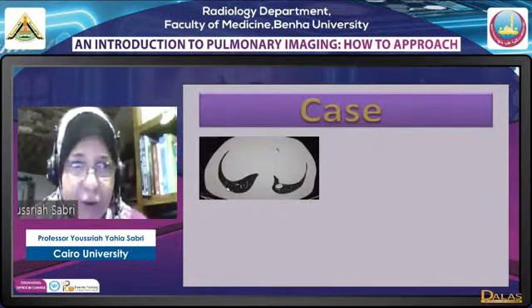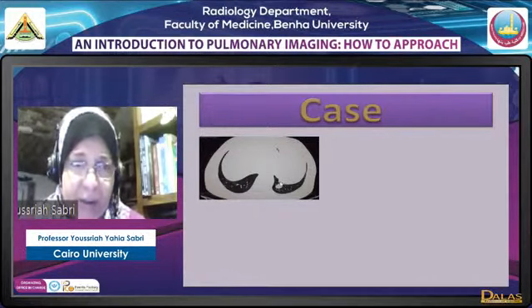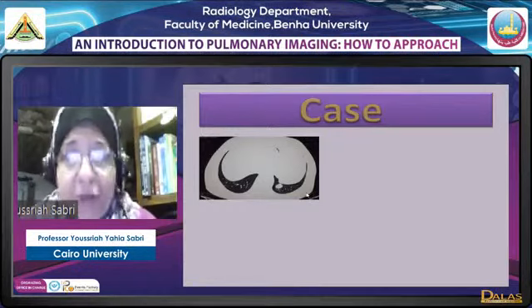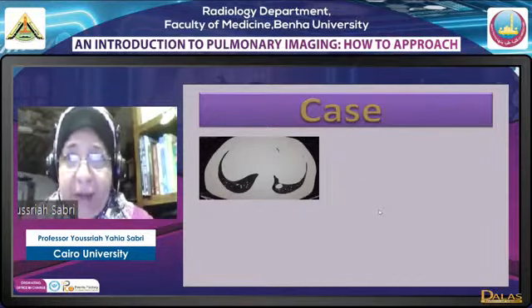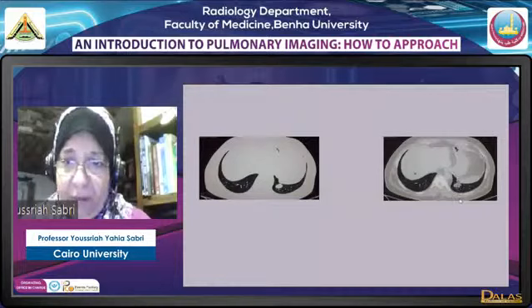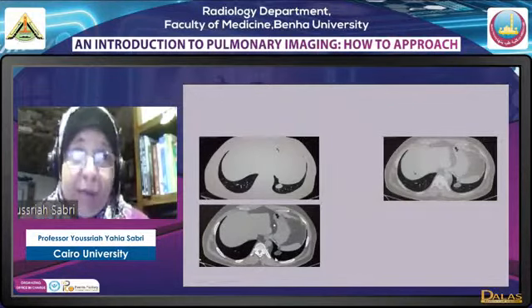Again, this patient had high resolution CT, and we incidentally discovered this left basal nodule. CT, high resolution CT, is not supposed to assess masses and nodules. So we changed the window and started examining the lesion by a normal lung window. We found that the content of the lesion suggested fat. So we shifted to the mediastinal window. Okay, there is fat. Are we dealing with a hamartoma?